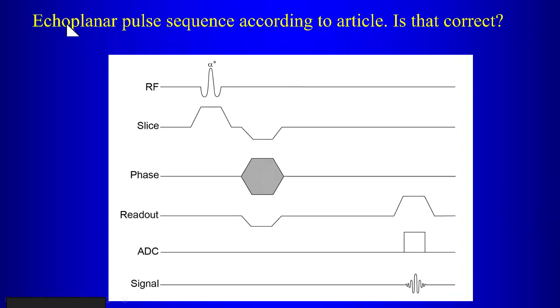Okay? According to the article, this is an echoplanar sequence. Is that correct? No. What is this?